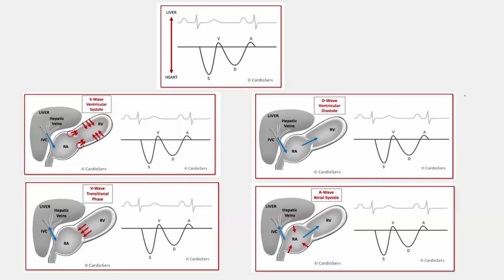Yes, yes, boss. Okay, the last part there, I want you to focus here. And I might have gone so deep into this topic, again, because I know you are smart and this covers everything you need to know about pericardial disease. That's why we have gone so deeply into this. This is the hepatic venous Doppler.